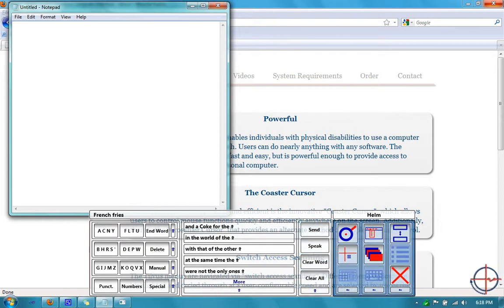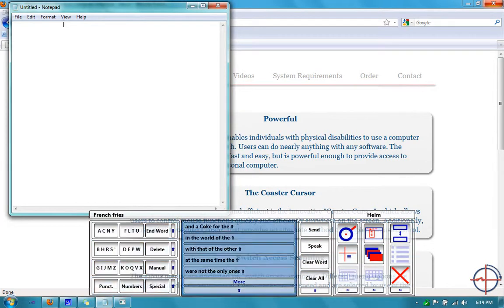So it's context sensitive not just for the previous word entered, but it can go several words back to determine the context for what you're writing. And that also helps to determine the context for the predictions, not just for the first word of each prediction, but the second, the third, the fourth, and the fifth as well.